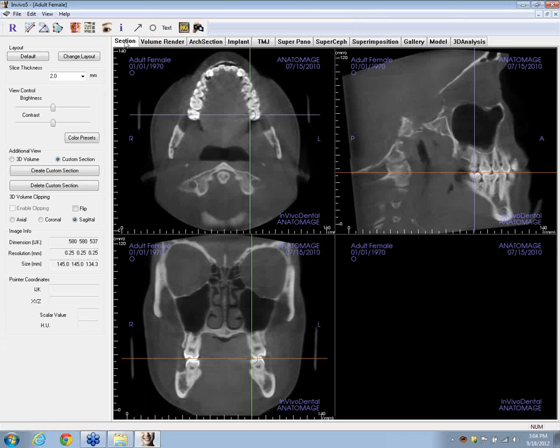This reorientation tab in the section view can definitely skew the angles. Some folks have a tendency to want to use this to get different aspects of relative landmarks within.